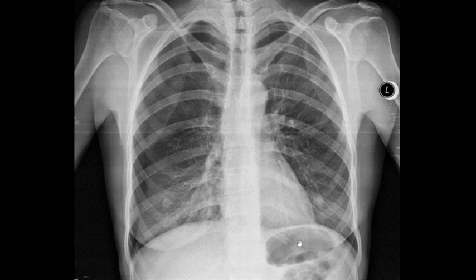Also, here we see something many people, even many doctors, often wonder about. This is normal air in the stomach, in the gaster. Normally, physiologically, we have some air in the stomach, and this is it, the air bubble in the stomach. And here is the diaphragm. The diaphragm is going all the way to the ribs. This is the costophrenic angle. Costarum are the ribs, phrenic, the diaphragm. It is important for it to be dark and sharp like this. So this is a normal lung field, obviously.